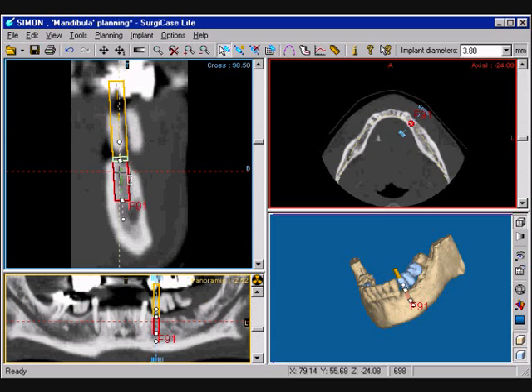It is now displayed in brighter colors and has handles for manipulation. Hold the left mouse button down on any of these handles and only release to end the operation. To rotate the implant, left click and drag at the circle. Rotate the implant to the new location. Release the mouse button to end. To relocate the implant, click in the middle, hold and drag to the new position. Release the mouse button to end.